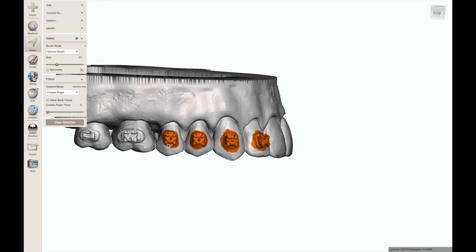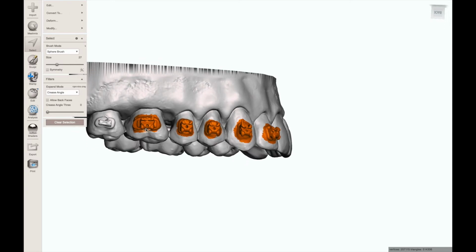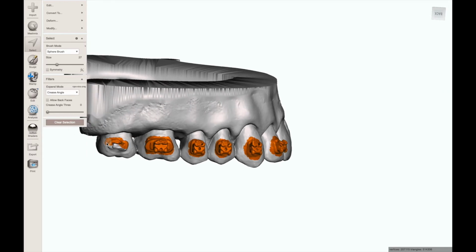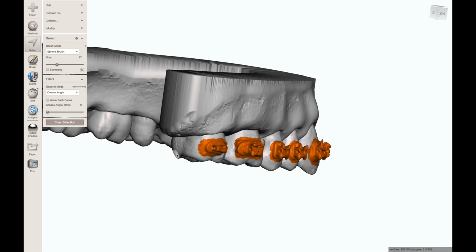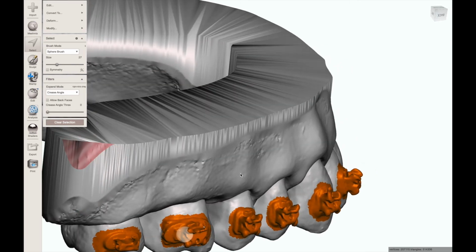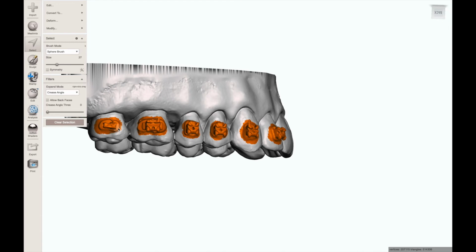I don't know how picky you guys are about having a perfect surface, and the algorithms of the erase and fill can be modified. You could make them more convex or concave. I'm not going to necessarily get into that today. I just want you guys to start to play around with this software. Make sure there's no little voids like that little white spot right there and right there. You have to have a solid orange fill for this to work.